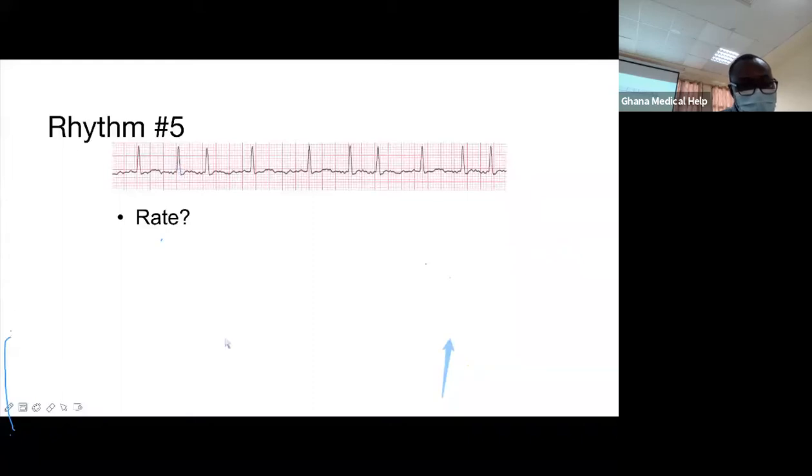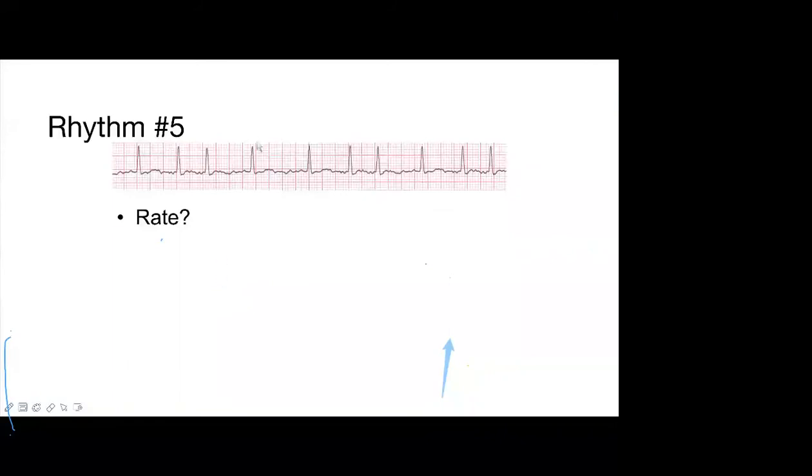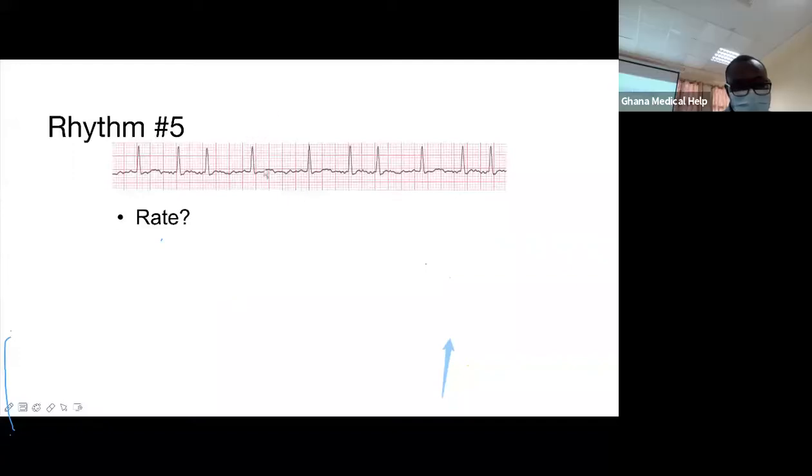Like some people had mentioned. But let's assume you selected that and I selected this one. I would have divided 300 by 1, 2, and that will give me 150. Which of us is right and who is wrong? Or another person decided to use this: the boxes would have been 1, 2, 3, 4. He decides to divide 300 by 4, and it gave him 75. Which of us is right?